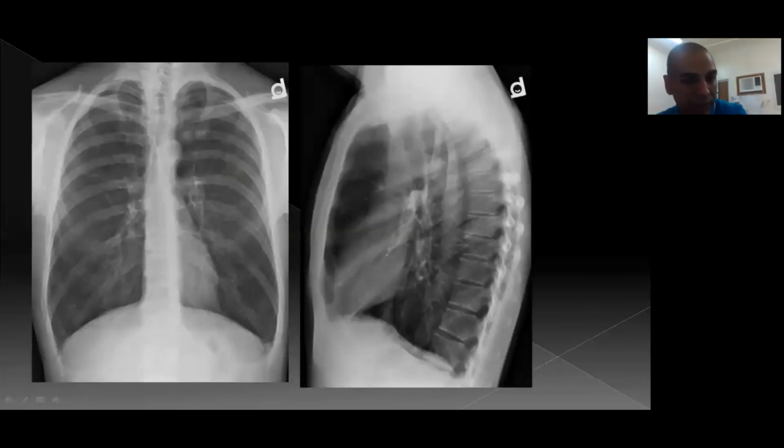Please, Dr. Ali, can you stay with us for this X-ray? Do you hear me? Yes, doctor. Can you please help me to identify the abnormality? There is bilateral flattening of the diaphragm, hyperinflated. Yeah, you are right. This is a typical case for hyperinflation or pulmonary emphysema.